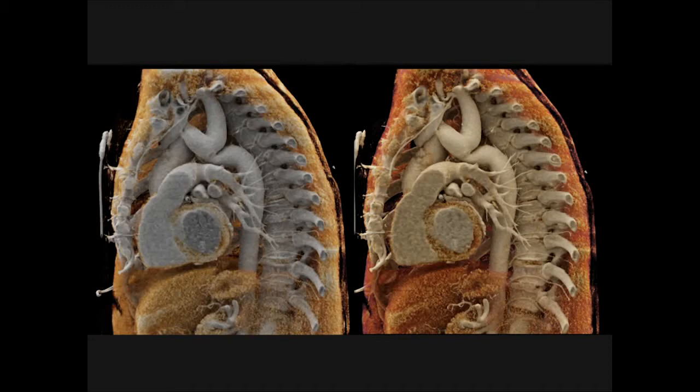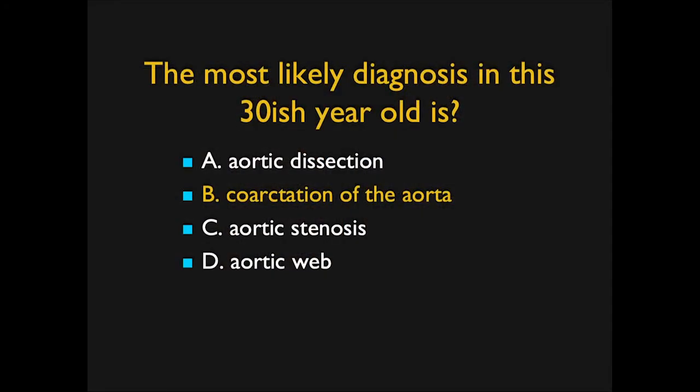Again, the sagittal view of the sagittal 3D in this case is optimal for looking at the aorta. Some people call it a candy cane or whatever else you want to call it type presentation, but just a very nice example.